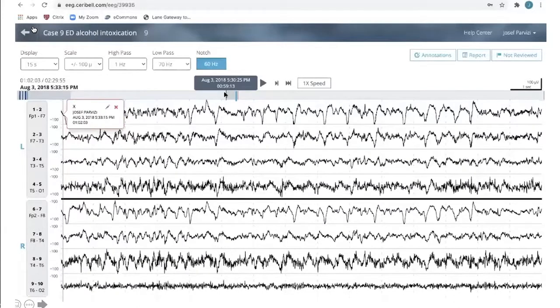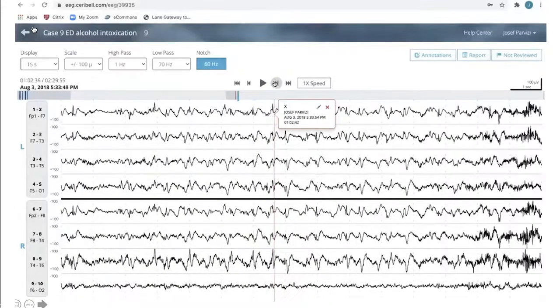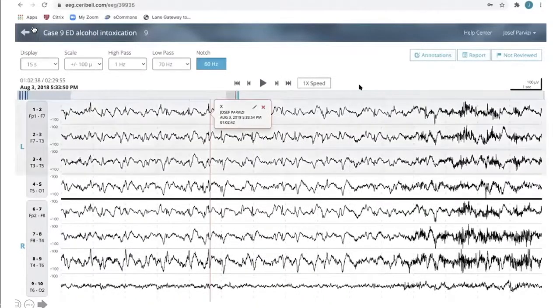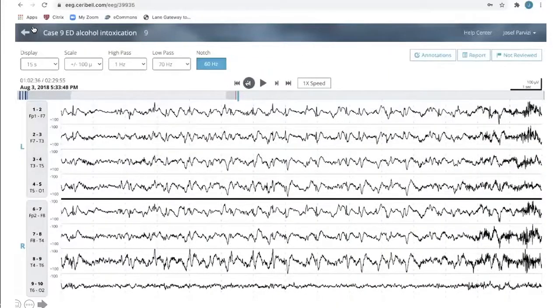So, and this goes along with a high likelihood of status epilepticus, based on the duration and the persistence of the epileptiform wave, the frequency. Right. So I had reviewed the EEG and had made some marks. Here's a very impressive one. Yeah, here you're seeing it extend posteriorly really well. It's as much anterior as posterior. So the AP, anterior to posterior distribution, extends.